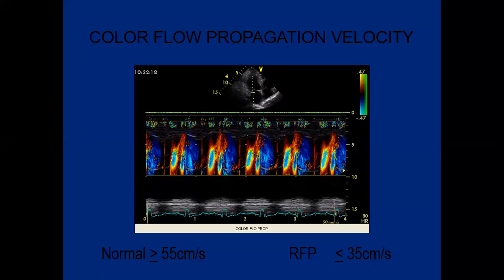Dr. Umesh Rajur, you asked this question, right? Yes, sir. So what we did, this is from Mayo Clinic. This is LV, this is LA. We keep an M mode sector volume across this, and we switch on colors. This is how the E wave is, this is the A wave, and this is systole. Again, E wave, this is diastasis, this is E wave, A wave. So we measure the linear slope across this line of first aliasing, go up to 4 centimeter up.